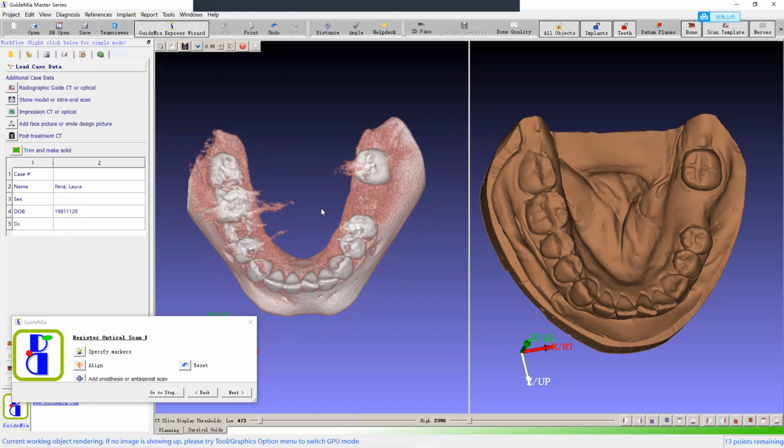Going back to scanning, we recommend having at least 4 natural teeth for partial cases if we want to align the models with the CT. If they have all metal restorations or ceramic restorations and no natural teeth, then very likely on the CT scan you will see scatter everywhere, and there's no way we can simply align them.